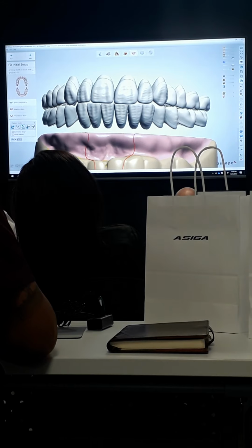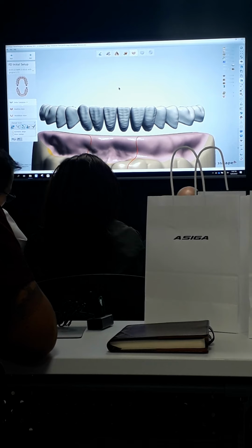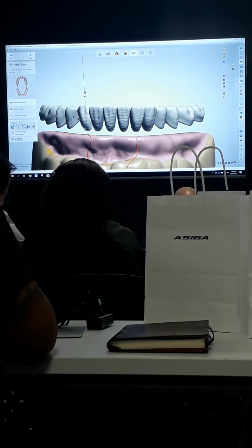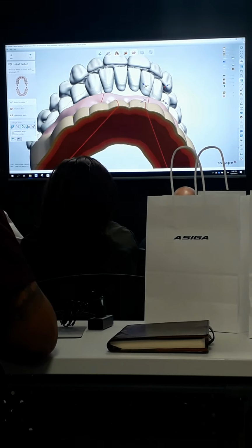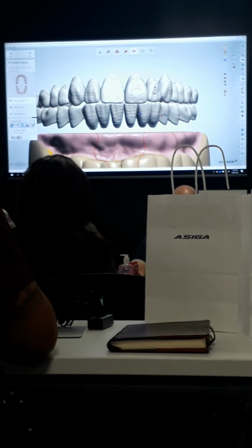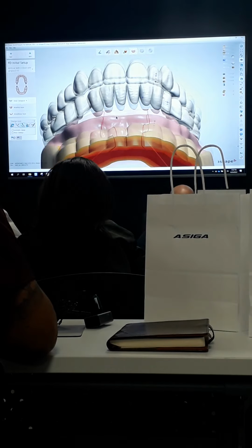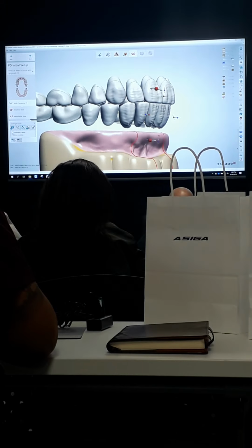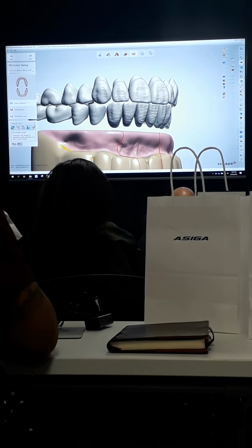And then one of the things I can see really clearly is my upper occlusal plane, making sure that it all looks flat, but it's harder to see the lower, so I'll turn off the upper teeth and make sure that I don't have a roller coaster going. So I can see here this canine is a little too tall. I also don't really care for the tilt of this one, so I'm going to tilt it forward a little bit. Back.